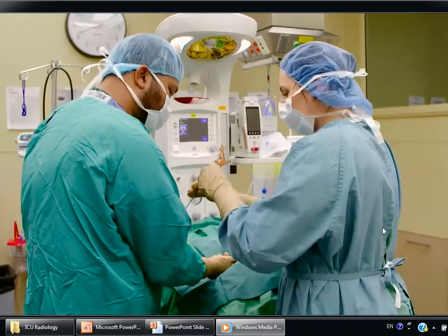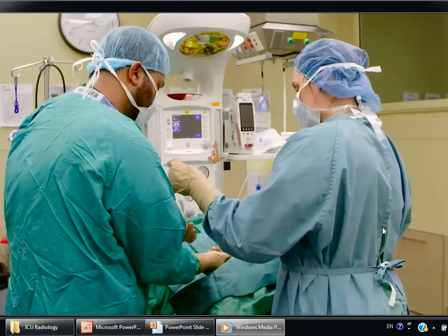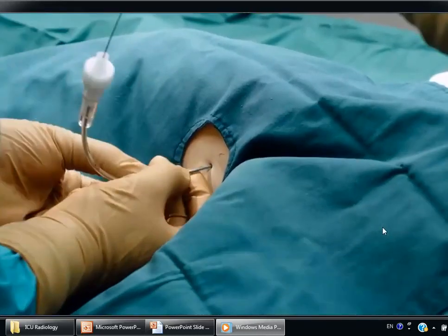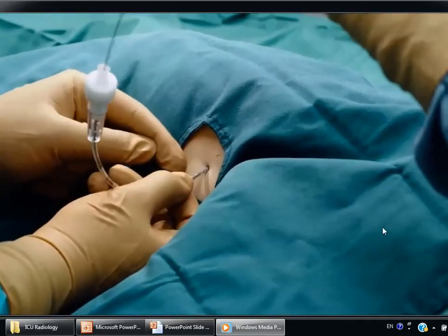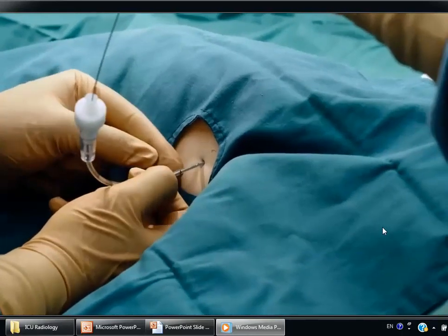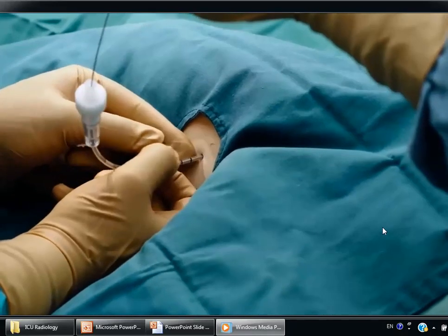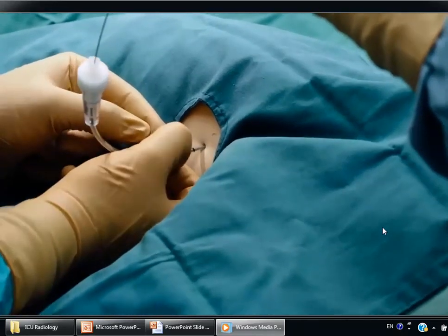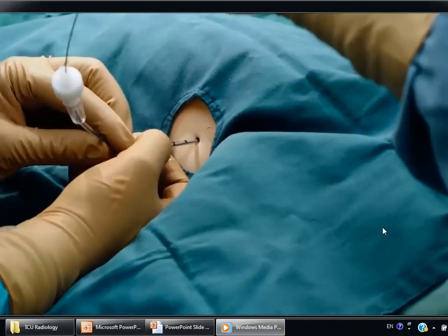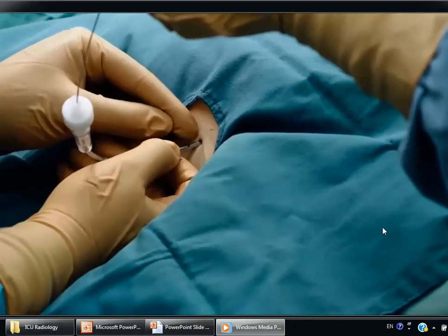So we have holes here. Yeah, I see them. So they are marking after the holes. Okay, so this is a full term baby. So we must be sure that the hole marks are inside. Then 1, 2, 3. So we are at 3. And even if it passed to you, it is here 5. So this is 5, this is 4, this is 3.